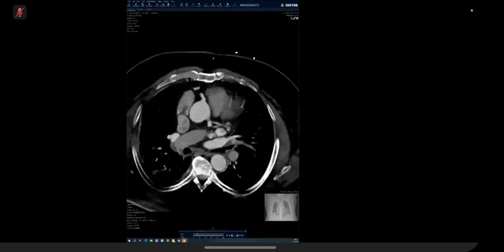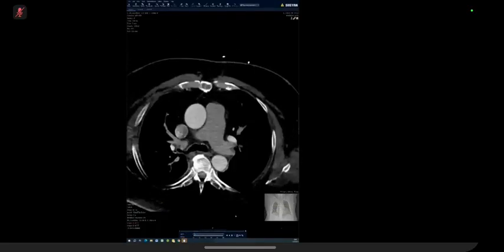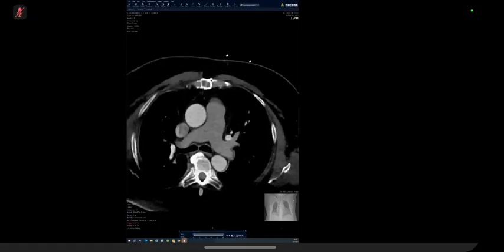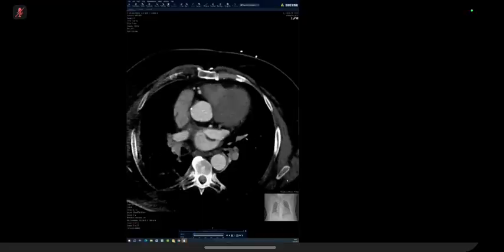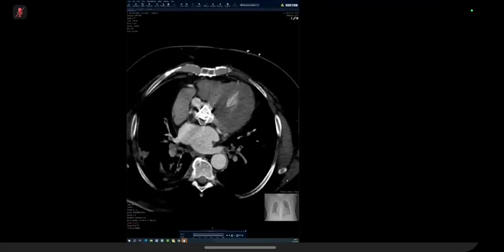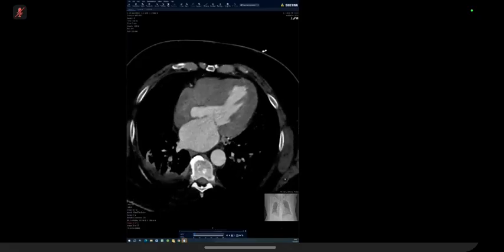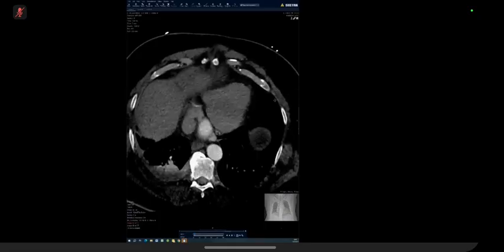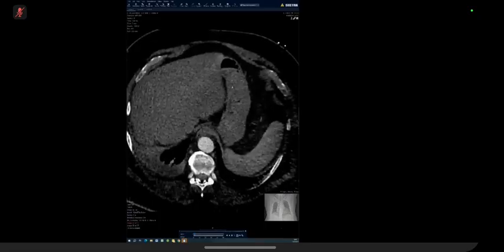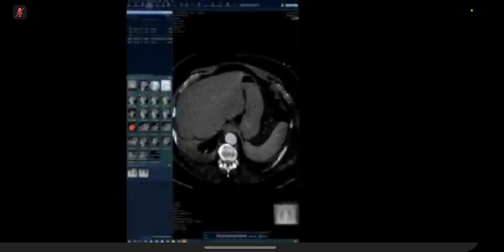I'm going to slow it down a little bit. So one thing to remember is somebody gave you a cardiac case, we must be doing well. And I'm going to give you another reformat to see how you do with that.